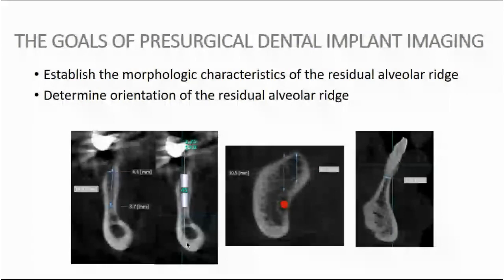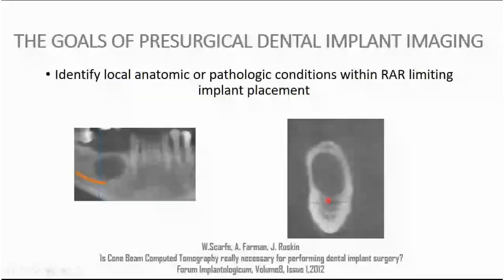Also, the picture on the right side is important to know when you have this kind of configuration of the alveolar ridge. Maybe we should consider for our patients to ensure them that their teeth in the present situation deserve as much periodontal treatment as we can give them, because the proposed implant treatment will ask for a lot of clinical actions to reconstruct that in the proper manner.